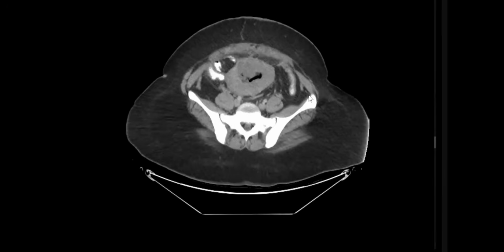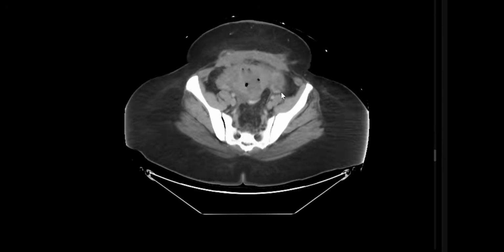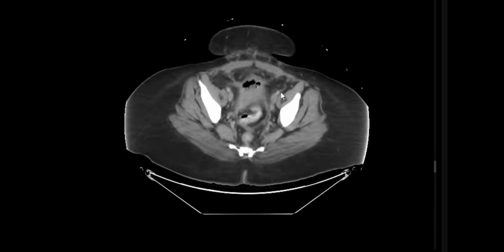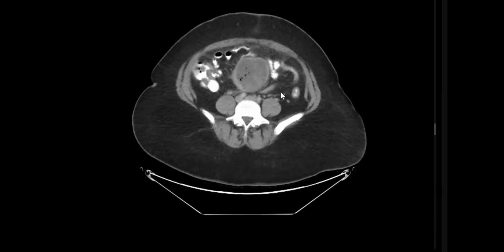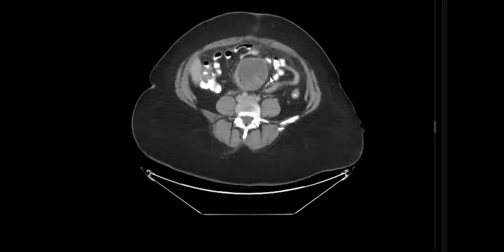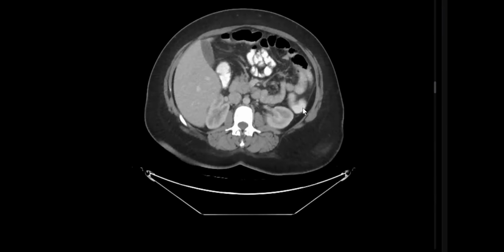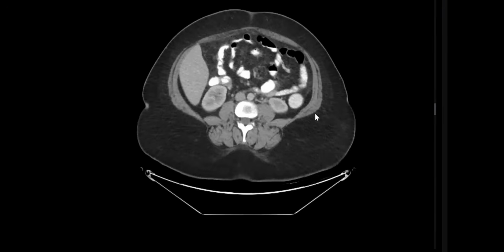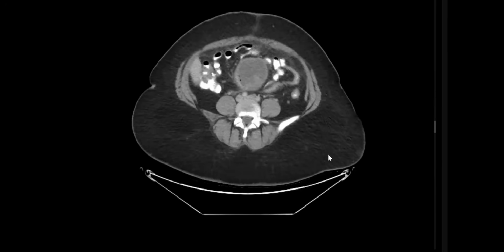Then I am trying to look at the extrauterine region to see if there is presence of any fluid collections or any giveaway of the uterus as such. Though I cannot see any such findings. Based on these findings of distension of the uterus with heterogeneous internal contents and few air foci, my diagnosis would be that of puerperal sepsis in a postpartum female who's complaining of fever. So I would like to inform the findings immediately to the consultant for drainage, followed by IV antibiotics for treatment of this patient.